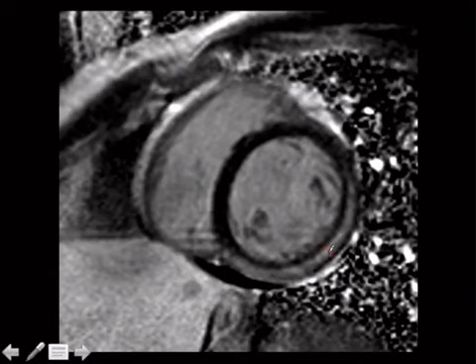We've got another late gadolinium enhancement study. And this time it sort of looks like an Oreo cookie, right? We've got black, white, black, with the enhancing part here in the middle. That is not vascular, right? Because remember I said that the wave of ischemia has to occur in this direction. You can't have ischemia if you don't have subendocardial involvement.